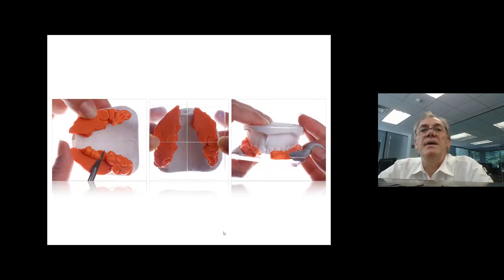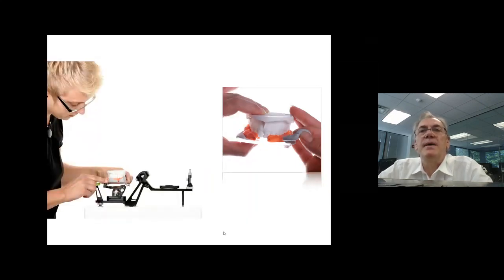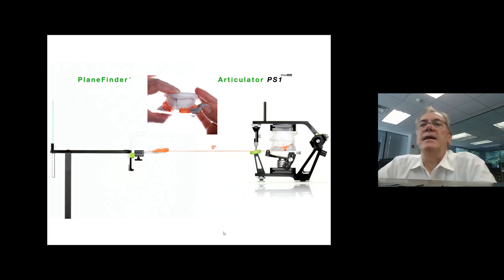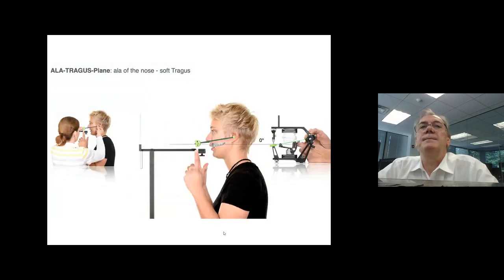And then by means of this plexiglass, we are able to line up the midline and the horizontal line to the center of rotation, bring this information into an articulator and basically fix it with a bit of gypsum and block it right into the articulator itself. So it's a manual transfer of the natural head position, therefore the ideal plane of occlusion, directly into a physical articulator.